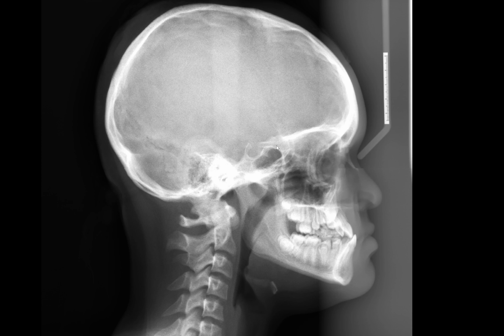The main point that I want to bring out is I want you to take a moment to take your eyes off of these bony tissues, bony areas, and then look at the soft tissue density. So try to follow the soft tissue outline of this patient's head and neck. What do you notice about the radiographic density about this patient's face versus the rest of the scan?